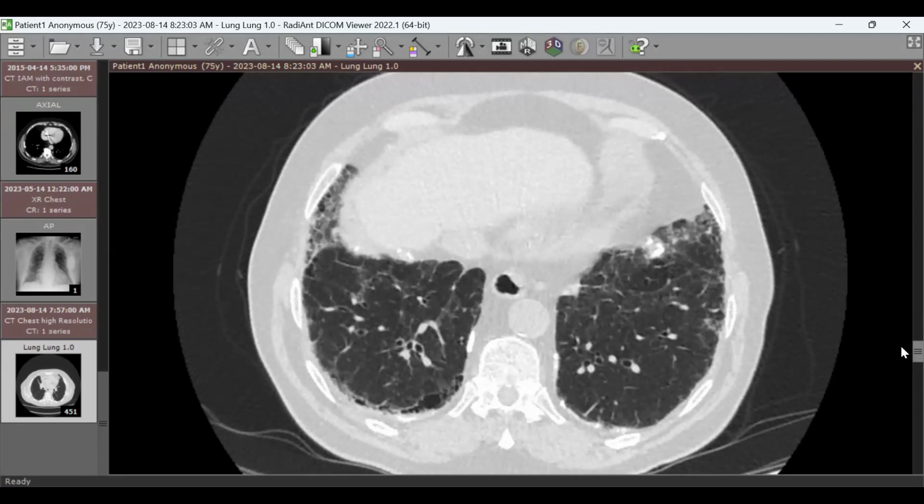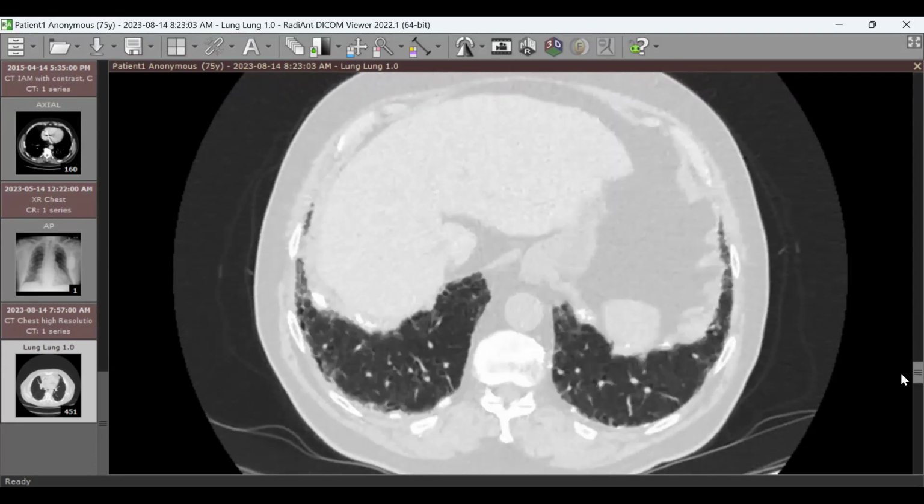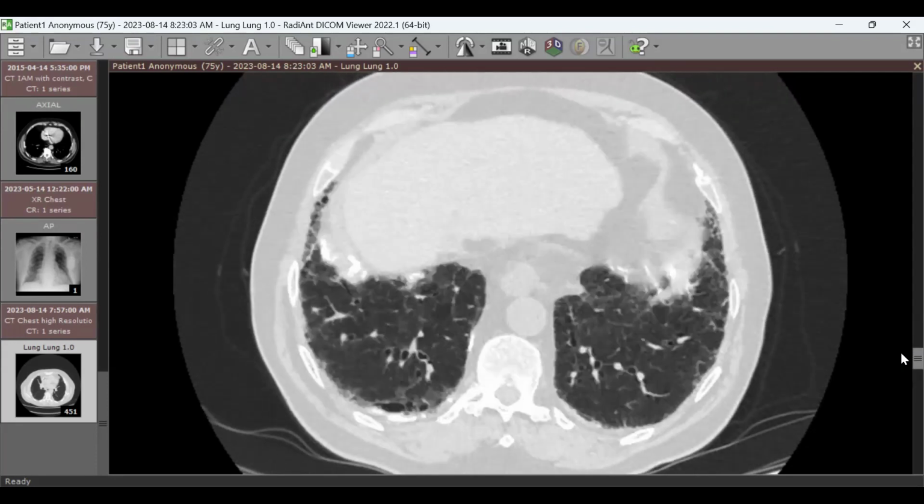So a fibrotic interstitial lung disease, of which pattern? Mostly usual interstitial pneumonia, or called idiopathic pulmonary fibrosis. This is the most common pattern. It is a typical UIP pattern. If there is no cause, this is called idiopathic pulmonary fibrosis. And if there's a cause.